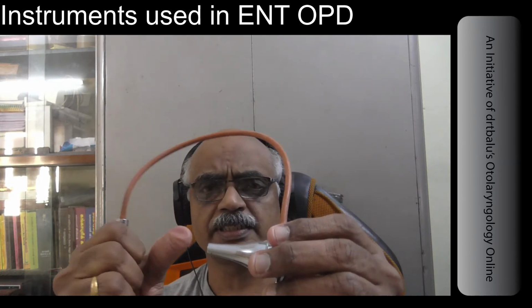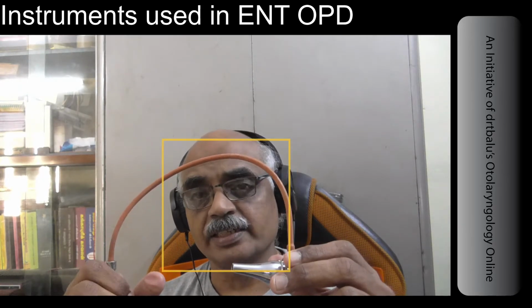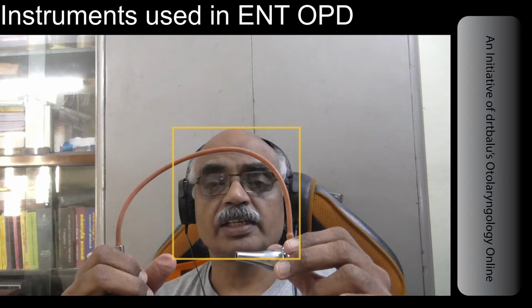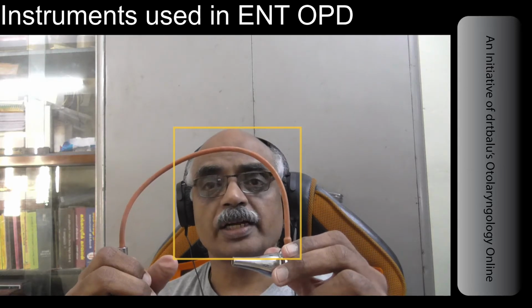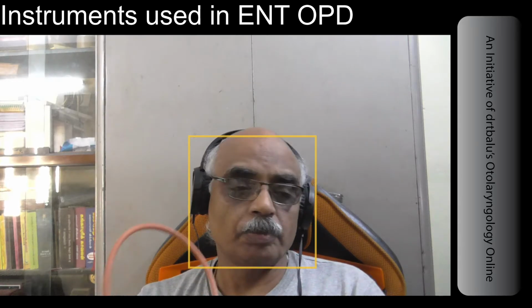Then on compressing the bulb, the pressure of the external auditory canal will increase, and as soon as you release, the pressure of the external auditory canal reduces. Thereby you can see the mobility of the eardrum clearly. So Siegel's pneumatic otoscope speculum is used to test for the mobility of the eardrum.